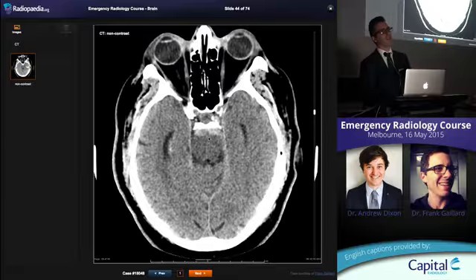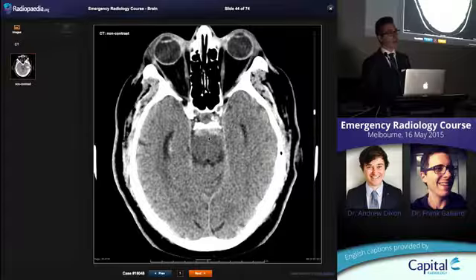This is a perimesencephalic subarachnoid hematoma. It's probably venous. They don't rebleed usually. They don't get vasospasm. But you can't just say that. So you will do a CTA, and at our institution at Royal Melbourne, we will then do a catheter angiogram. We'll do an MR with an MR angiogram. Then we'll probably repeat a CTA or MRA at some point, and then as an outpatient, repeat it again.